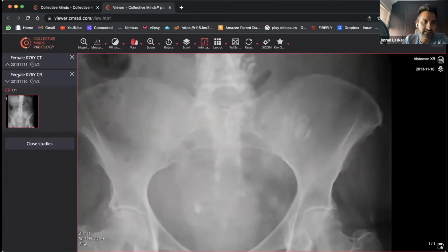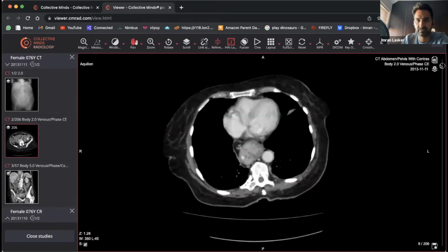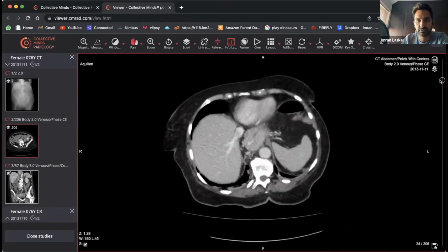So this patient didn't get any better, so they needed to end up doing something else. So as usual, you do a CT scan to try and see it. And I might have given the answer away already. But as you scroll through, we're scrolling through front to top.